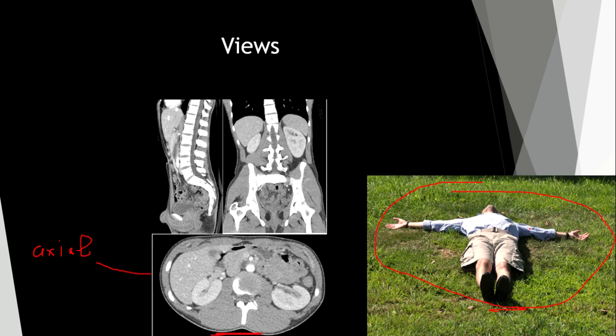This is the left of the patient, always left, and this is always the right of the patient. It is a standard scheme. This is a sagittal view, easy to remember from anatomy. Sagitta from Greek or Latin, I don't know, means arrow. So this view shows us like an arrow going through the human body. And this is the coronal or frontal view, named after the suture on our skull.